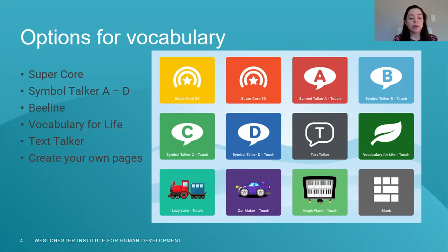There's Beeline, which is for people with relatively good language skills, and it's single words or short common phrases that are used with high frequency, and it's a rigid structure. So the user can generate sentences and it becomes really fast because they use motor planning in the Beeline vocabulary set.